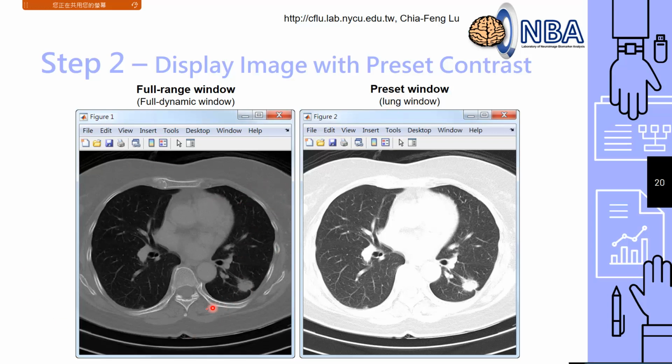This is a chest image, but I know most of you don't have an idea about the anatomy. So basically, right here, you can see this is the spinal column. This is the ribs, okay? Different ribs right here. This is the area of the heart, okay? Mostly you can see the large vessels right here. You can see the chambers right here. This is the heart, okay?